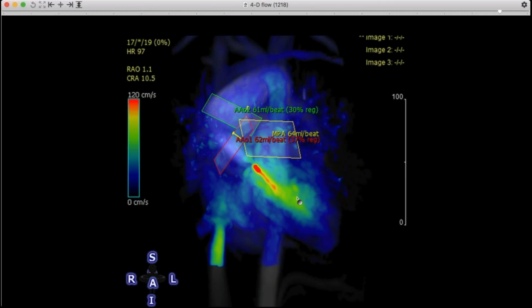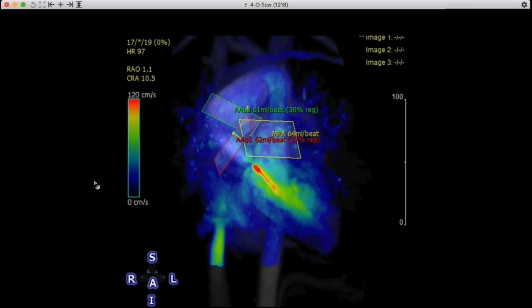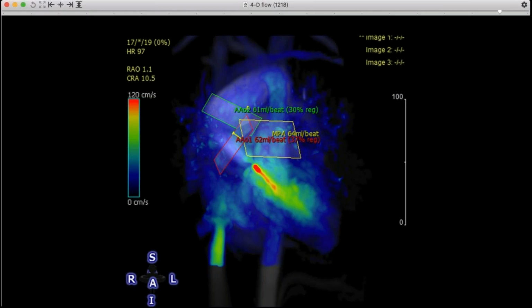I think Seth has shown us a unicuspid valve before, so I was hoping he'd be on to see it. So Jeff, how much stenosis was part of this unicuspidity? Was it both stenosis and regurg?